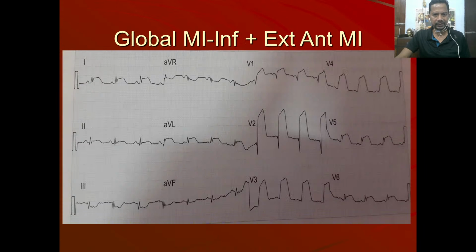So this ECG we have seen. So this is marked ST elevation from V1, very tall ST elevation. Okay, and V2, V3, V4, V5, V6. In inferior leads also ST elevation. Lead 3, there is ST depression. Here there is elevation, and lead AVF also there is mild upstroking of the ST. So this patient has a very advanced extensive anterior wall MI. Lead 1, AVL, V1 to V6.